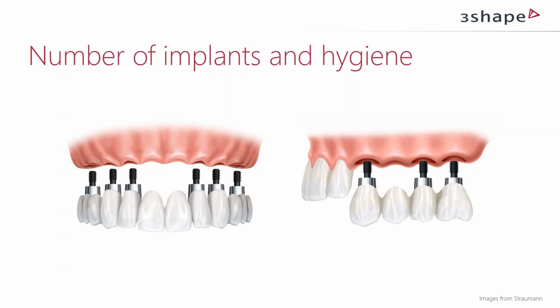Yes, knowing the facts, but now when we saw the pictures, of course, we should have considered that. It's always easy to say afterwards. But also thinking that way, thinking hygiene. How should the patient take care of the bridge afterwards? That is also something that we can contribute already in the planning step. To see, is this a hygienic bridge, or is this an as-many-implants-as-possible bridge? So let's start thinking hygienic maybe, because it helps the bridge to survive for a longer time.